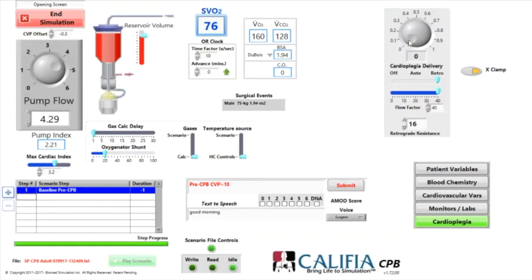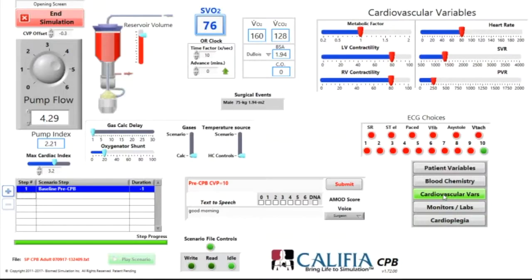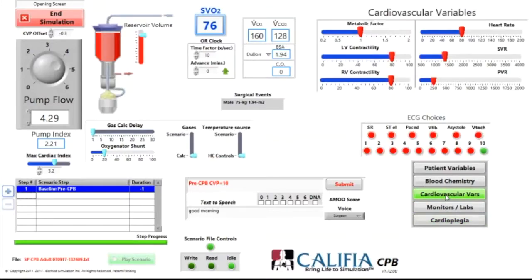And we're going to give cardioplegia. Let's see how it kind of comes up. I think you could probably get maybe 250 a minute, depending if you want to go to 40 or 50. So say for example you wanted to create some sort of activity. We could turn this off. Go back up to cardiovascular parameters. You can click one of these values down here, or maybe up here somewhere, and say we're getting some activity.